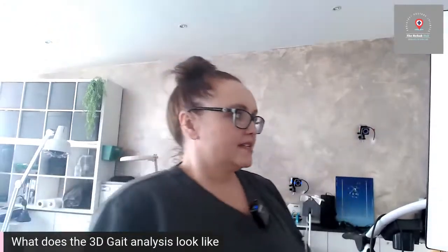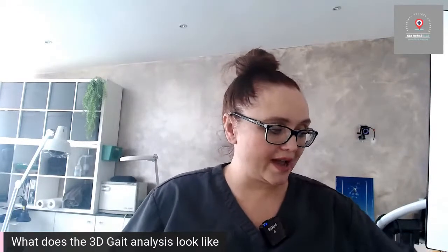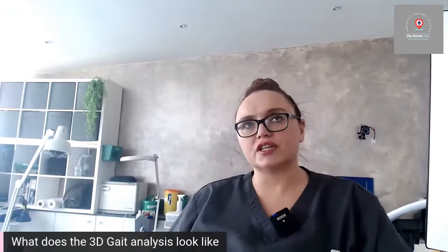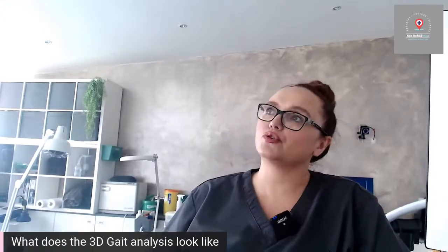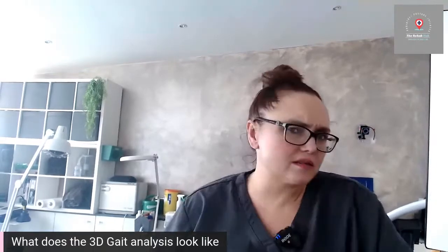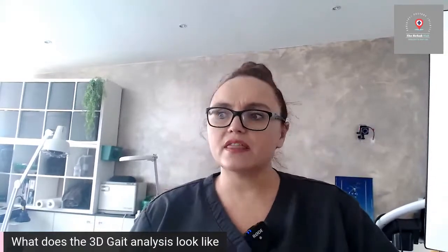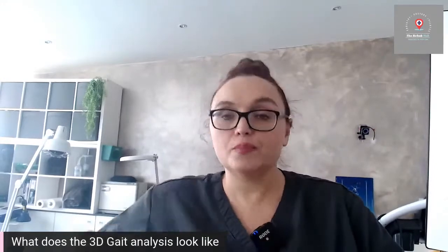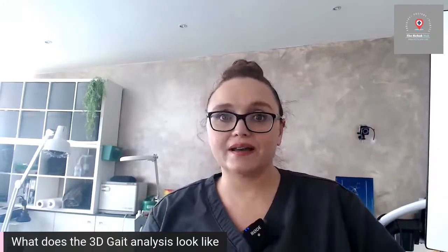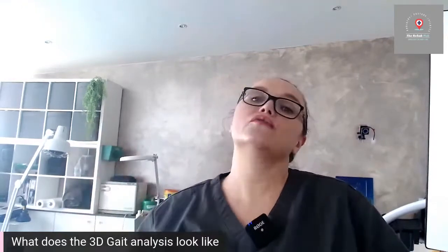Now, in terms of booking, you've got a couple of choices. You can choose to just book a gait analysis, which is absolutely fine. We can also do things like gait retraining. So the first thing you would do is a gait analysis. Say, for example, you're running a marathon and you're maybe getting to the 10-mile mark and your Achilles is feeling a bit funky, or your knee's feeling a bit funky, or you're hitting a wall. Then we can help you through that, provide rehabilitation, but also help with gait retraining. We can take you to that point where you're getting your fatigue, do your fatigue training, and then work on, right, what is it we need to change?